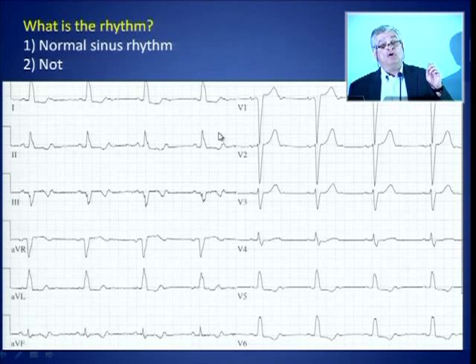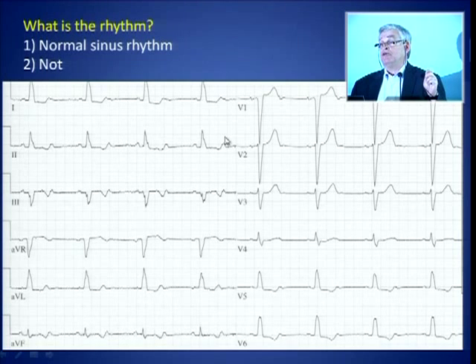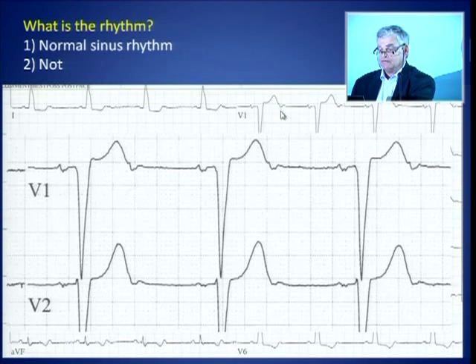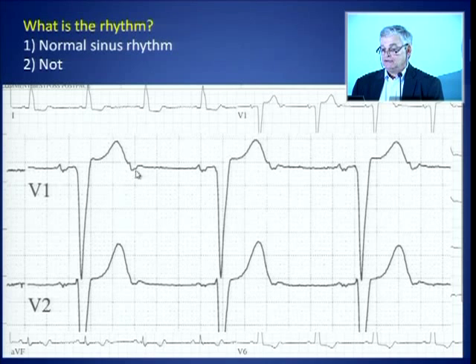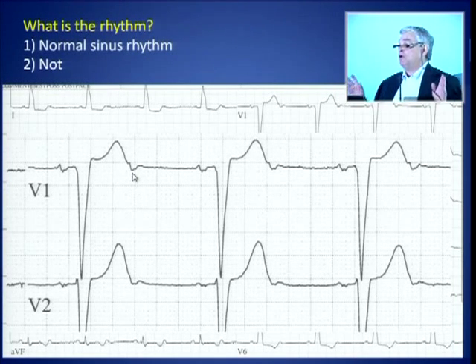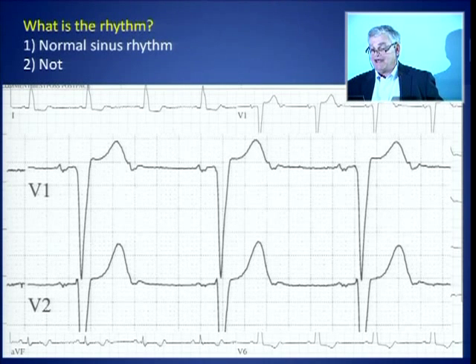We have to know to look for them, not just where to look for them. So when we look here, we see P, QRS, T, but then we see a high frequency deflection at the end of the T wave. Let me blow that up for you. Look at that. See that? That cannot be part of the T wave. That is high frequency. See this?